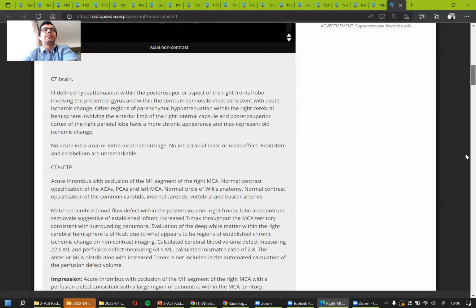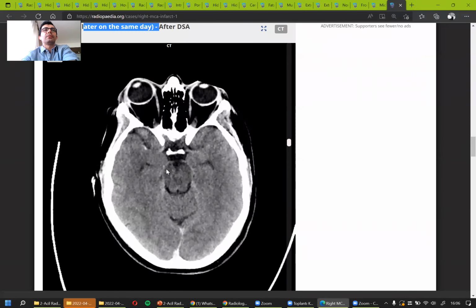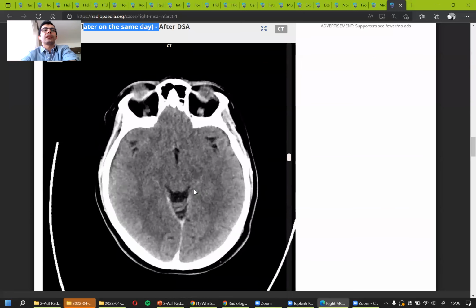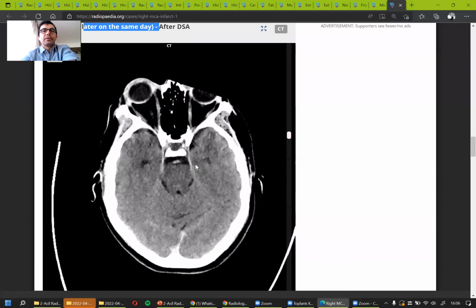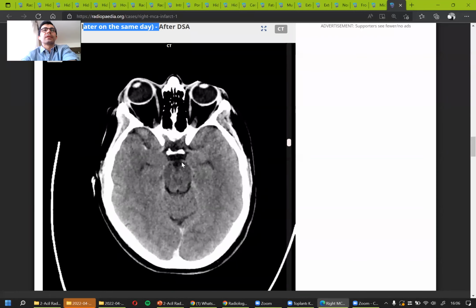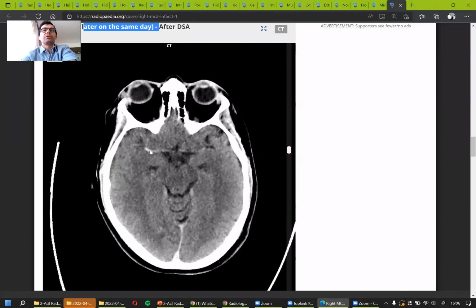It doesn't appear here, but I'm looking at the CT scan which is taken later on that day again. We will go with other examples. It's not easy to see. On the subarachnoid space, as we have talked, the blood vessels are running through that. When I see a thrombus, with cellular components and everything, or a hematoma, it looks bright on CT scan, right?